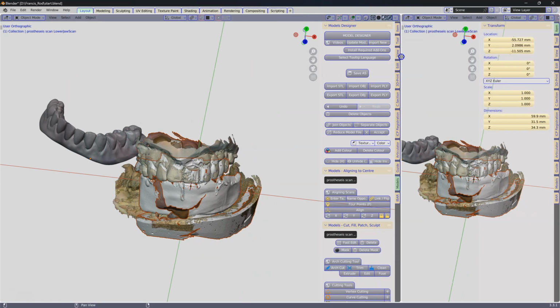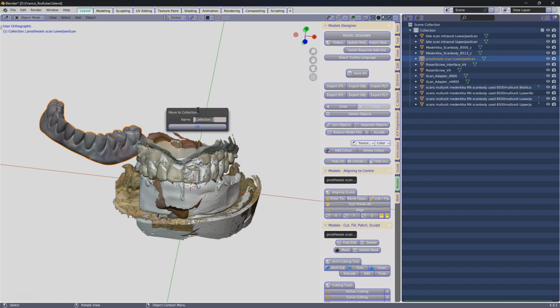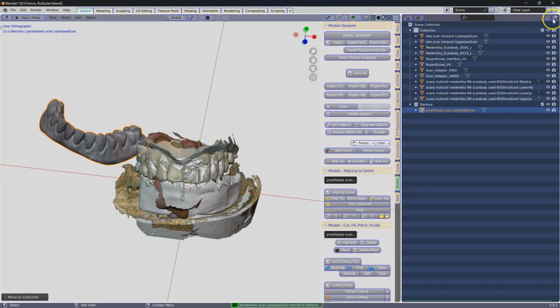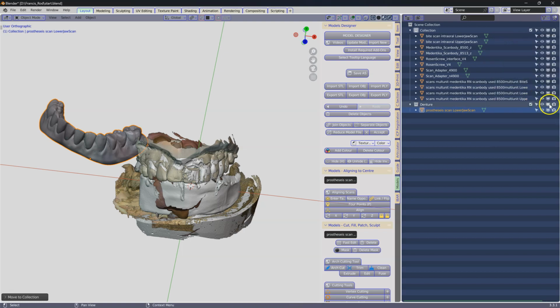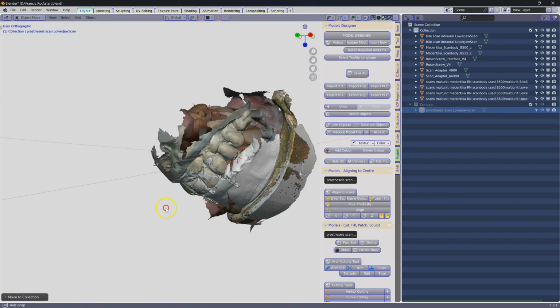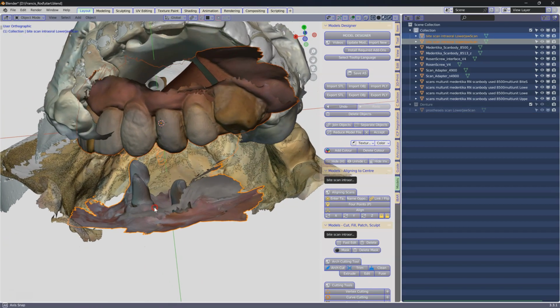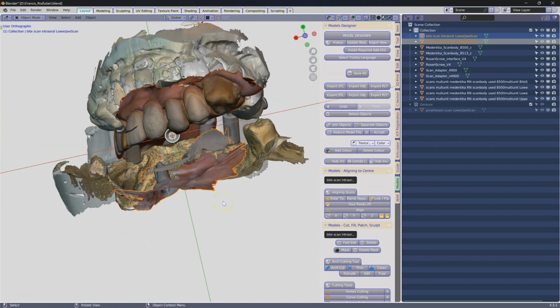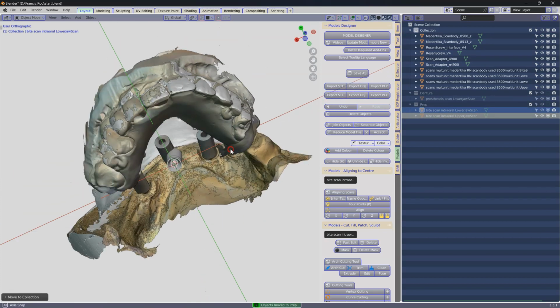First thing is we're going to do some object management because there's too many objects on the scene. Select M to move, and this is my denture, and then we're going to click OK, and we're going to unfilter these two. The one that looks like a screen, click on that. That semi-permanently hides it. We've got these tooth preparations. We're going to move that as well. I'll just put prep, and we're going to hide that as well.